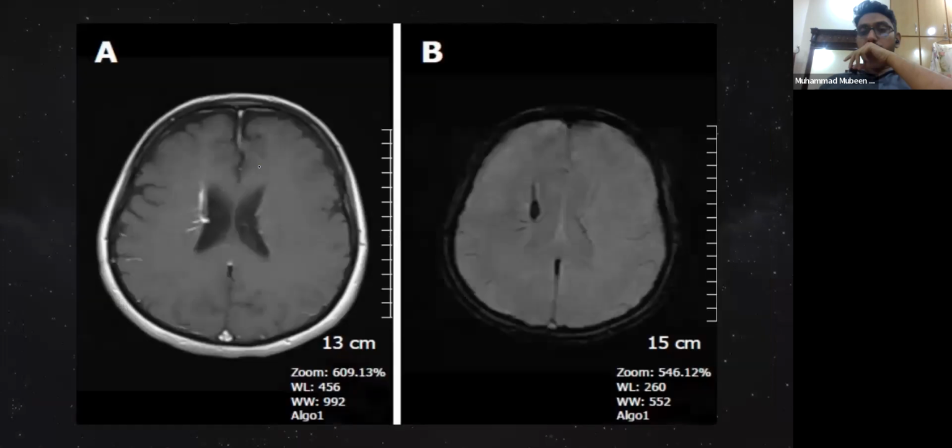On the left, there's a T1 weighted image with black CSF, white matter, and contrast enhanced vessels. You can see there's an abnormal vessel here which should not be present. You might miss that if you're looking through the sequences without any suspicion for that. But on SWI, you can readily identify there's an abnormal structure present here which should not be present normally. And you could go back and see, oh, this is a venous anomaly, a developmental venous anomaly. Sometimes you don't see anything abnormal on other sequences, so the only sequence to show you a developmental venous anomaly, DVA, is SWI.